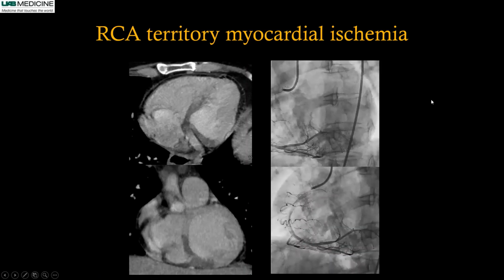So incidentally, always look at the myocardial perfusion defect. This is almost like a resting perfusion of the myocardium. If there's a defect and the wall is not thinned out, which can happen with chronic MI, always suspect that this patient may have coronary artery disease causing myocardial ischemia.